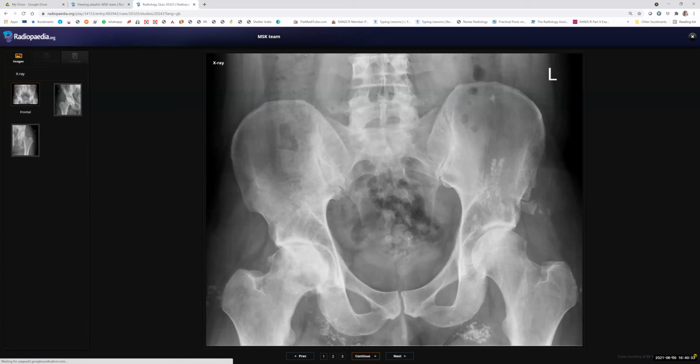So this one. Is there any history? The patient came with right hip pain. This is a pelvis radiograph, in which I can see that there's avulsion of the left anterior superior iliac spine. That is an old one. You can see the well corticated margin. Yeah, ignore that.